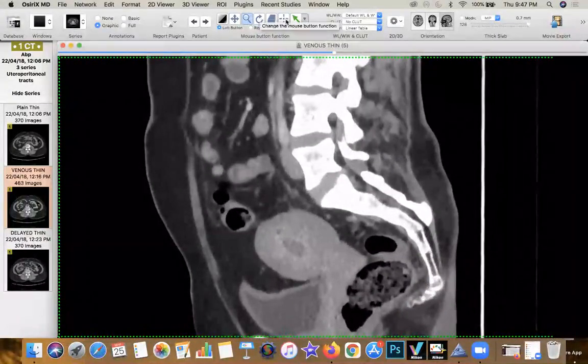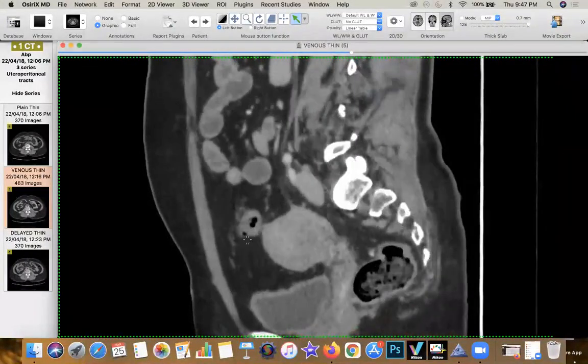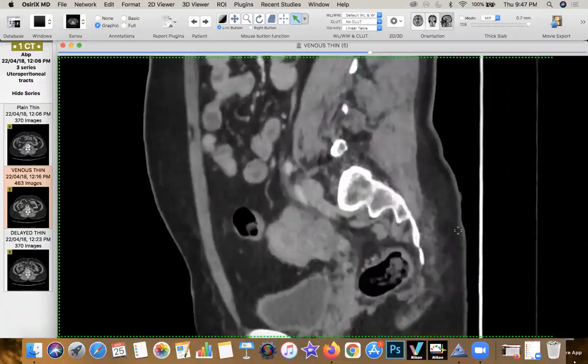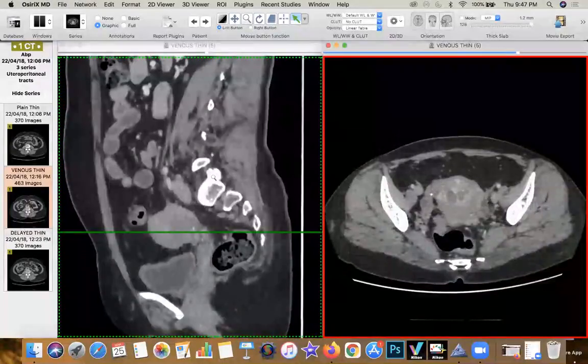But interestingly, if you start looking at the cavity per se and then you start seeing what's happening, this is the area 1 cornu laterally. I'll put this on actual images also for you all, just for the sake of completion. So you can see the cavity going up. But unusually, when you're starting to look at the cavity, it doesn't look normal at all.